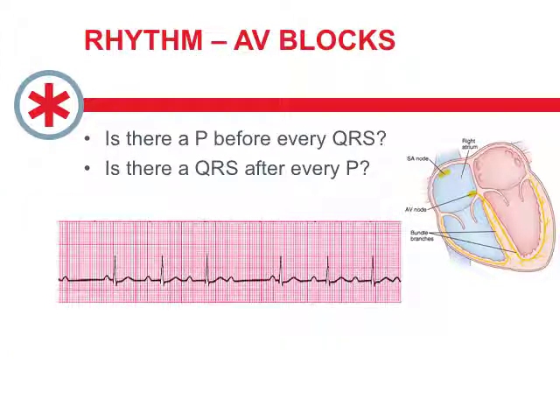So how about this? Let's have a look at the rhythm strip and take a moment to pause and figure out what's going on here.